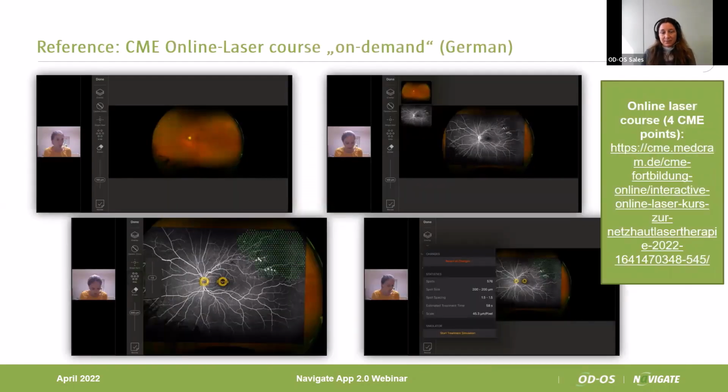So this is the example of an online course that has been recorded as a full video. One teacher presenting several cases with a proposed treatment strategy. And the interactive portion of it is that as a student, I can pause this video. I have the same cases on my app, and I can plan the treatments myself and later compare with the solutions presented by the teacher.